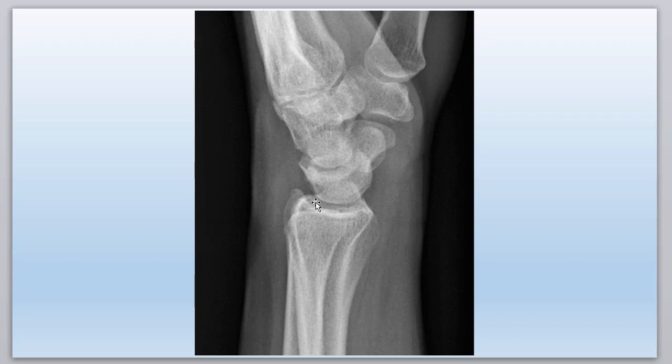And so, yep, that I think is about all I want to tell you there. Okay, you can work on those for a while. Go back and forth. You've got to train your eyes to see this. Watch the pisiform when you do this. I can see it. It just pops right out in my mind. I'm a very visual learner, but you can see all these bones real nicely. These are the key bones. So a clinically very important set of radiographs here is this lateral view of the hand.